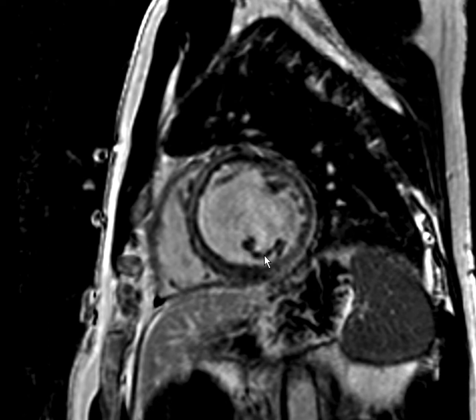So it's impossible to see subepi before subendo in an ischemic event, which means that this case is not an ischemic cardiomyopathy. So we need to think about differential diagnoses of cases where there is subepi and mid-wall enhancement all around or diffuse in this way.